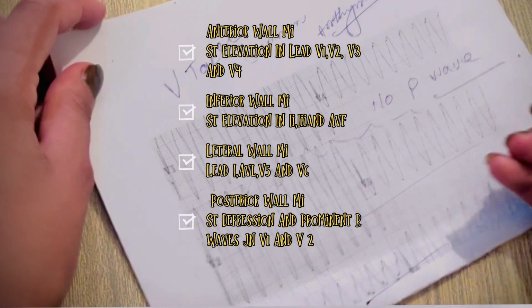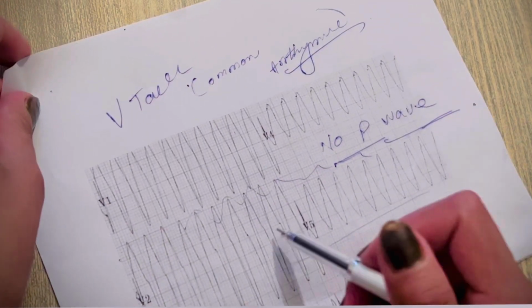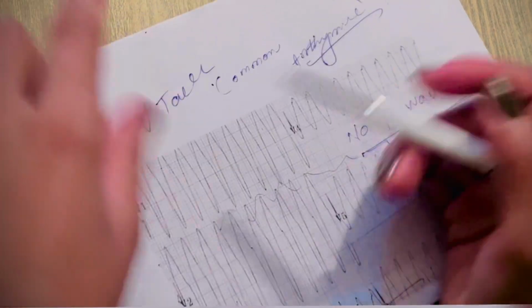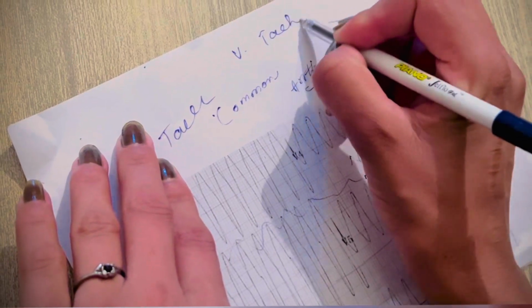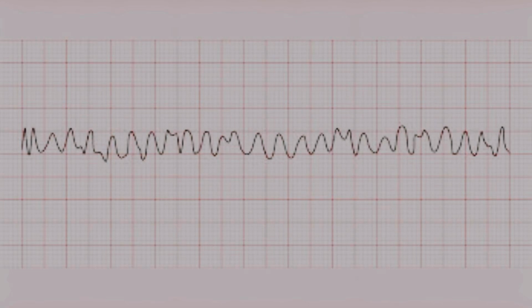Now let's review some common arrhythmias. First, we have VTAC. Ventricular tachycardia is a serious emergency where we often need to administer a shock and refer the patient to the cardiac unit. Next, we have ventricular fibrillation, which is characterized by this pattern with no distinct QRS complex.